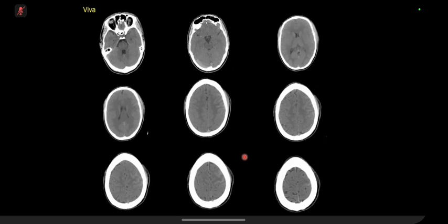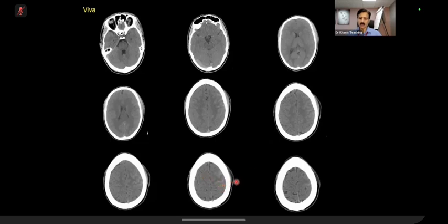Yeah, there could be calcification in the gyral folds, gyral calcification. Look at the density. It's not that high. Yeah, you're right. Calcification will always be more than 80 Hounsfield units. If you see, this is something like the gray matter. It looks more like hemorrhage to me. Most likely. What else can it be? How are you going to tackle it in the exam?